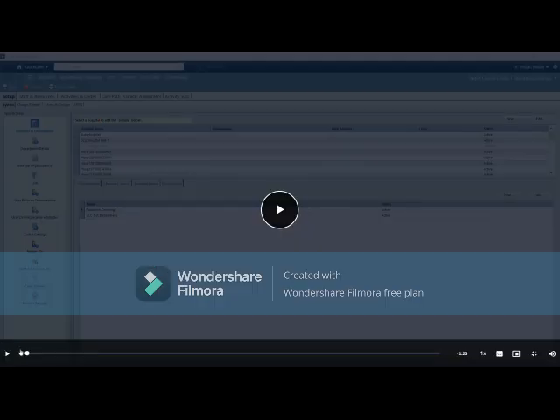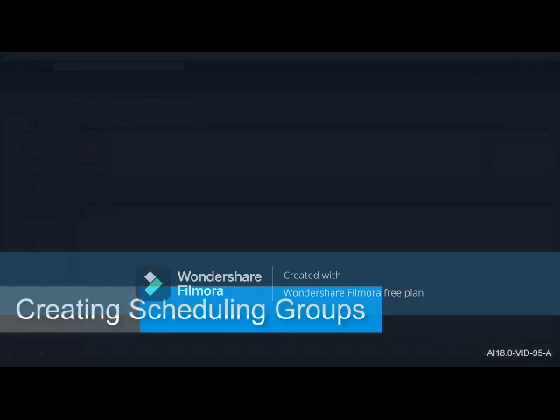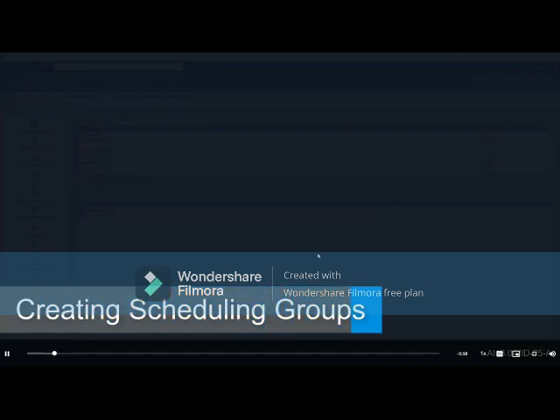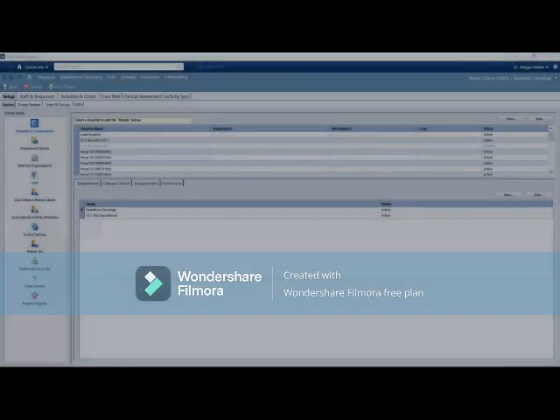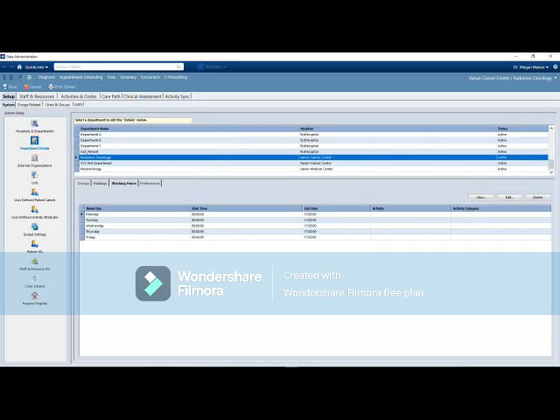Create and edit a group. The system administrator will create and edit a group to the clinic's ARIA system in Data Administration. Select Setup. Under Setup, choose the tab for System. Select Department Details. Select the department and hospital in which you would like to add a group. In the section below, select Groups.